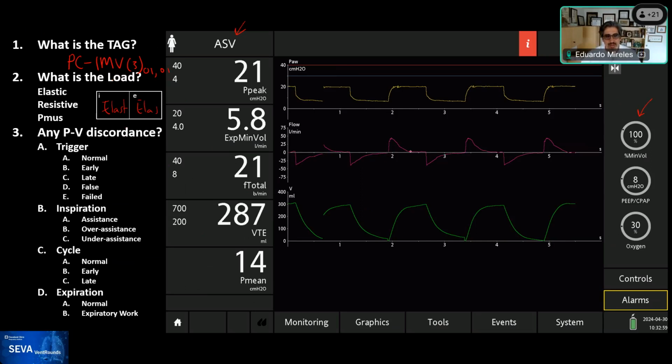so you see 2 and 3, and this is almost falling in the second, but the breath returns to baseline basically within half a second of administering the breath. So it's very fast, and if you see during exhalation, also rapidly returns to baseline, and it's probably more clear on this one over here.